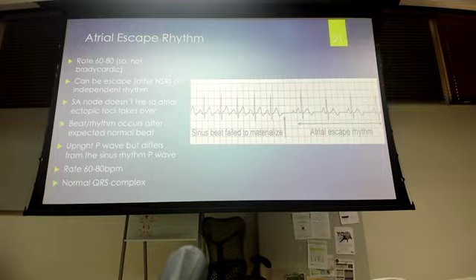How you know it's an atrial depolarization is even though it's occurring later, it still has a P wave associated with it. Okay? But if you compare this P wave to these P waves, this is your indication that it's from a different foci in the atria. These P waves are more rounded. This P wave here, here, here are more pointed. So that tells you it's a different foci in the atria that's causing this depolarization to occur.